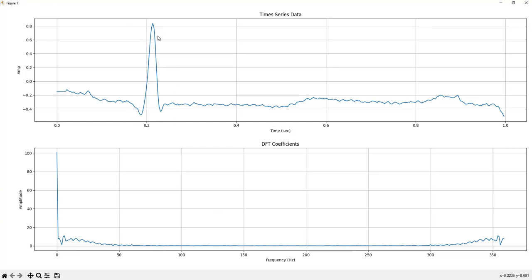For example, 70 Hertz may happen here, but in this case maybe 2 Hertz, 2 Hertz, 2 Hertz, and maybe it's 5 Hertz, 10 Hertz, because it's speeded up in this case. But in this case we have some characteristic instantaneous frequency. It's dramatically increased, right?